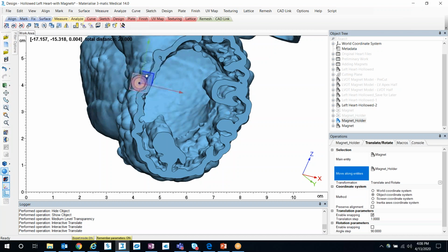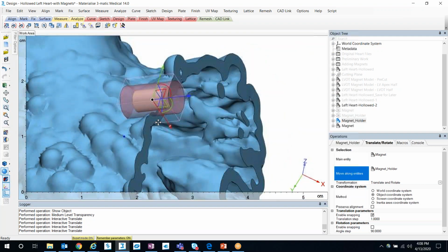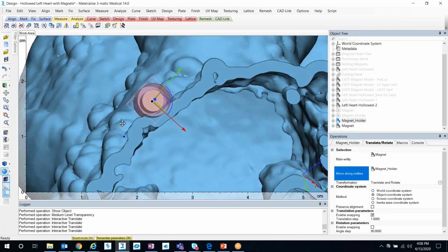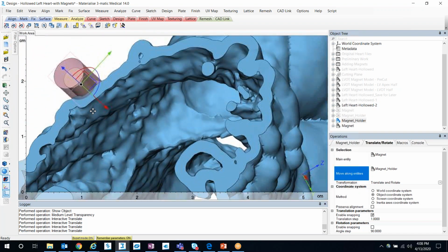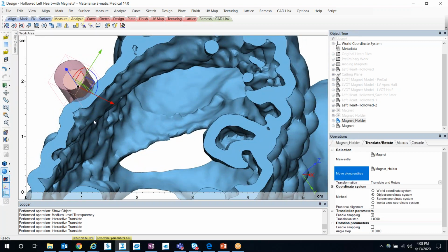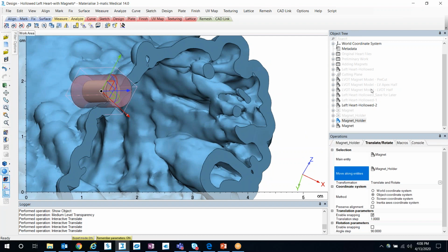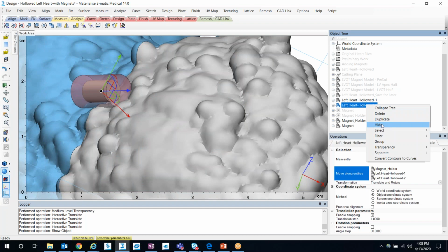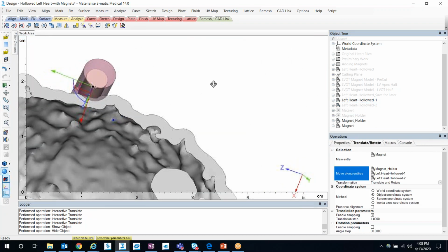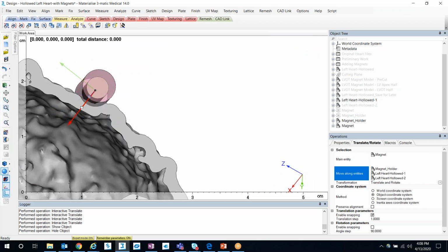And so we're just going to move somewhere on the surface here so that the union of the model intersects with the model here, provides enough legroom that the holder won't rip apart when you print this, and it doesn't intersect with the interior volume of the surface here, because we're concerned about preserving that surface. If you also want to check the other side, let me just show the other side of this model and hide the blue side. And so now we're also not intersecting over here. That looks good. You may need to maneuver this around, so you might move this a little bit inward if needed.